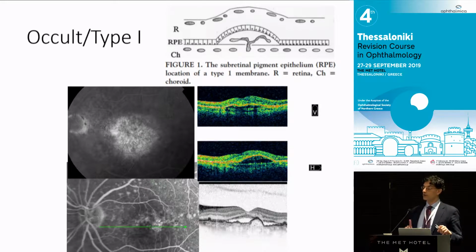There's a fluorescein correlate. It's not the same. So in fluorescein angiography, when they were doing the original argon laser trials, they had another definition which was classic or occult. And that's not absolutely the same as type 1, but similar. So the correlate of type 1 CNV is fibrovascular pigment epithelial detachment, and this is the fluorescein correlate, which is speckled hyperfluorescence. It may have radial lines, which is the RPE folds, and if you have stereoangiography, which we hardly ever get now, sadly, it'll be slightly elevated and slightly leak-late.